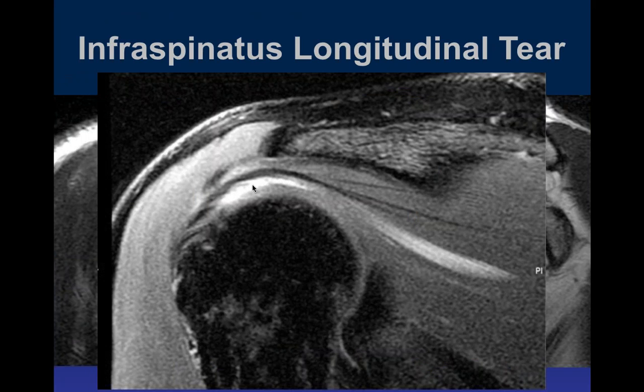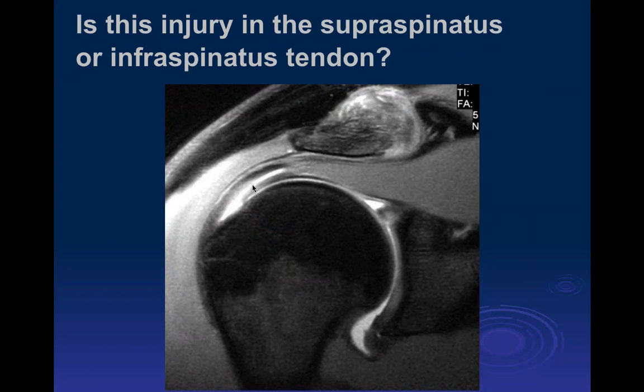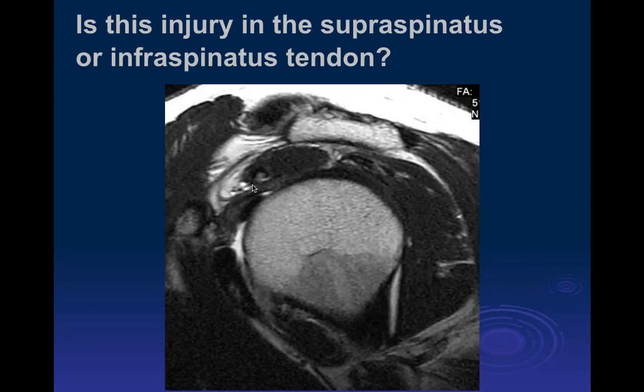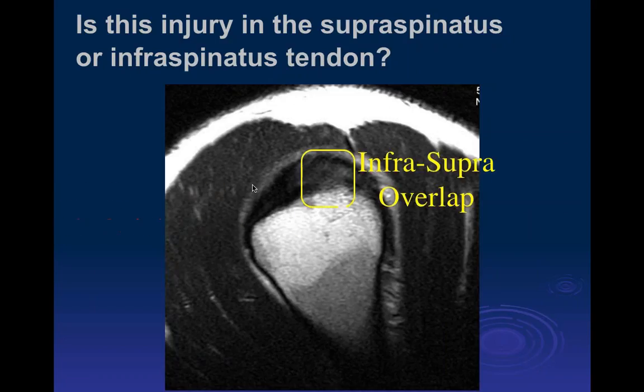Whoops, wrong direction. We follow the contrast. It actually extends posteriorly, so it's primarily within the infraspinatus tendon, even though it can extend fairly anteriorly because of the way the fibers interdigitate.